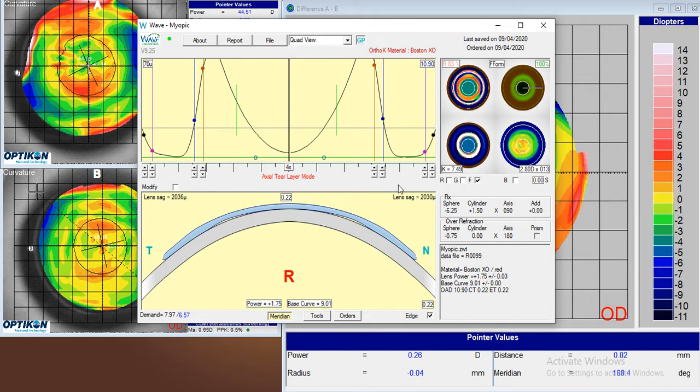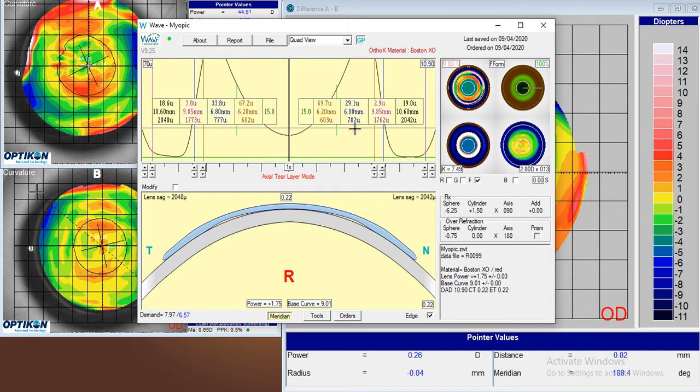So I'm going to go into 4x just to speed this up a little bit. 100% mode. We're almost there. So, oh, we got a little shift in the position there. Let's see if that changes it. So what happened here is we click down, we increase sag out here, but if we look at the value, we're at 782 and we started at 787.